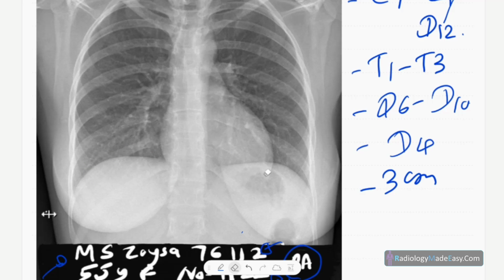The other thing is the gastric air bubble you have to look for. Here you can see the gastric air bubble, that's a normal position. It is important in identifying situs inversus and dextrocardia. We have to find out the gastric air bubble and also esophageal atresia in children. It will be absent. The next thing is soft tissues. Yes, you can see the soft tissues here, whether there are soft tissue swellings.